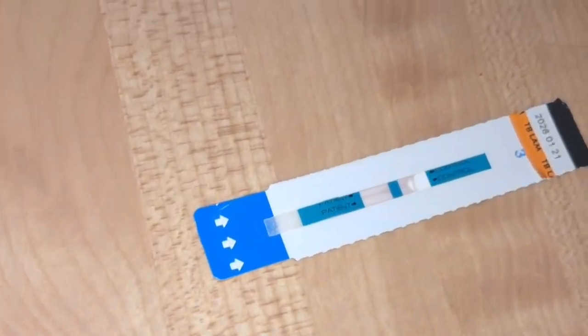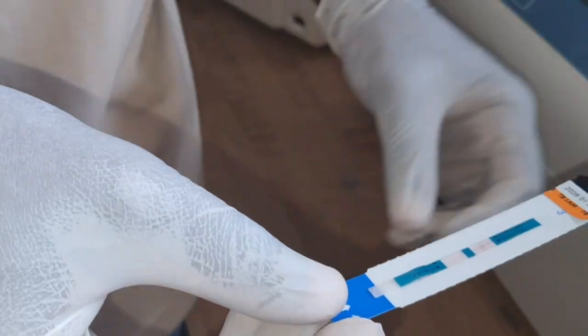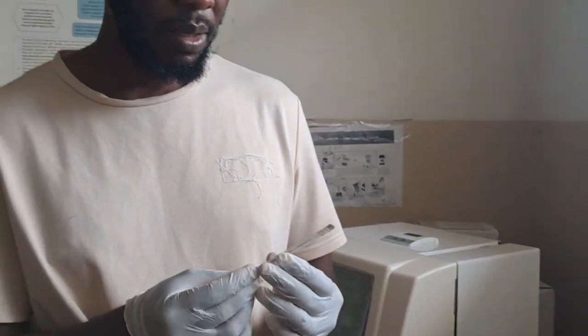So we are waiting for our test to finish. Our 25 minutes is up. Now we can have a look at how these results can be interpreted.